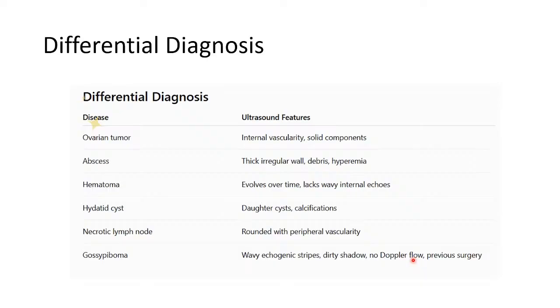So we are talking about one of the serious post-surgical complications that you as a sonographer or radiologist must not miss. You equally complicate the dilemma if you miss the gossypiboma, because it can cause those reactions, and it can be so bad for the patient, or the patient can eventually die.